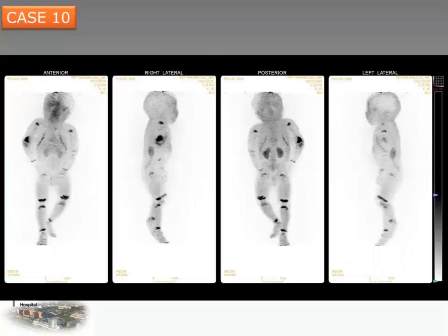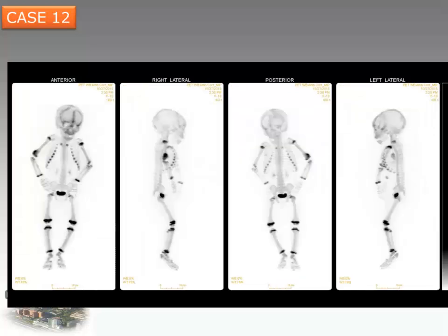These are the complete blood pool images, and these are the complete reconstruction of the late phase. Look here and here. Okay? The radiologist with the X-ray survey detected only the right humerus fracture. Nothing about the skull and nothing about the right radius.